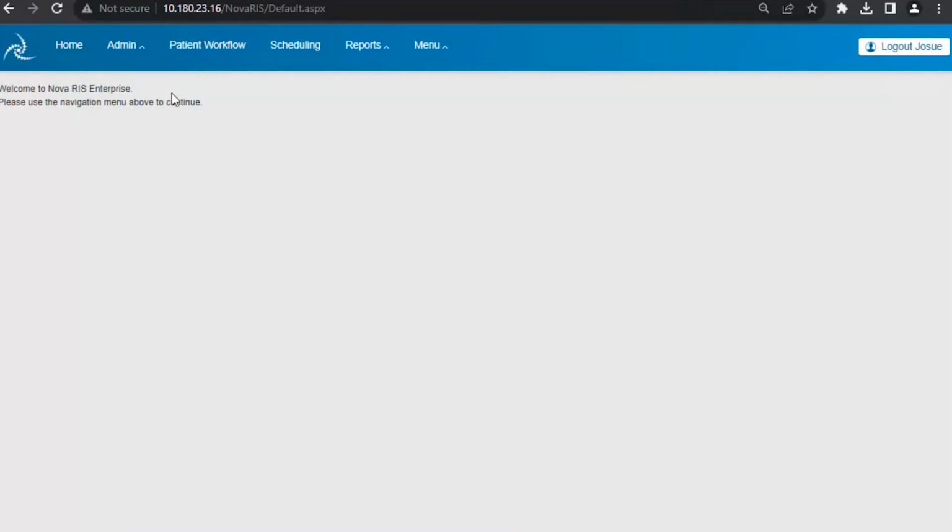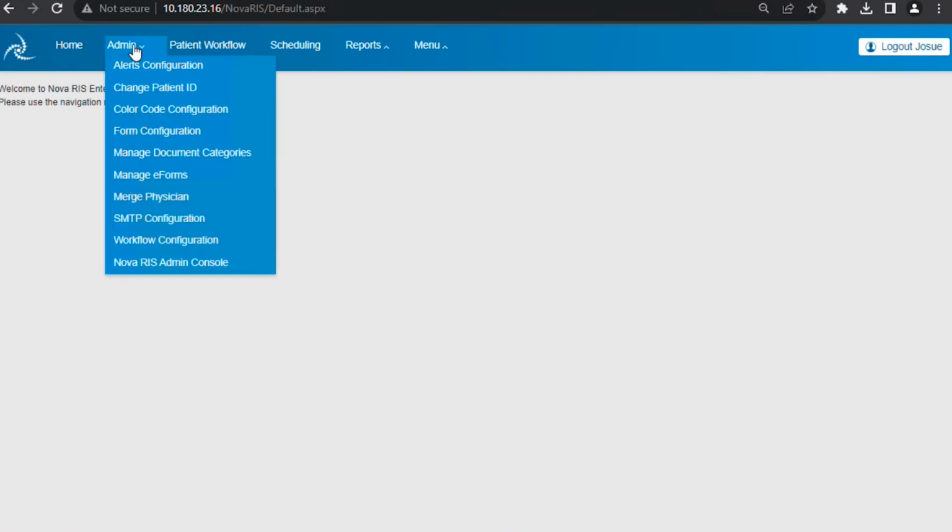Continue on from some of the other admin tools. So far as Dina has shown you, some of these you may use more often than others. Some others you may even just set one time when you start with our solutions. And then for all the time of your working, you might not even use it again, because once you set it and that is the way you work with our solution, you might not be required to change some of those. So, going with some of the other admin tools that Dina did not show you, I will.